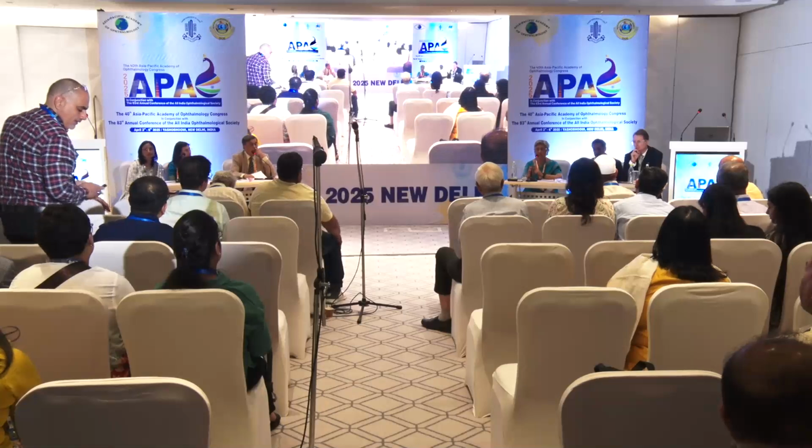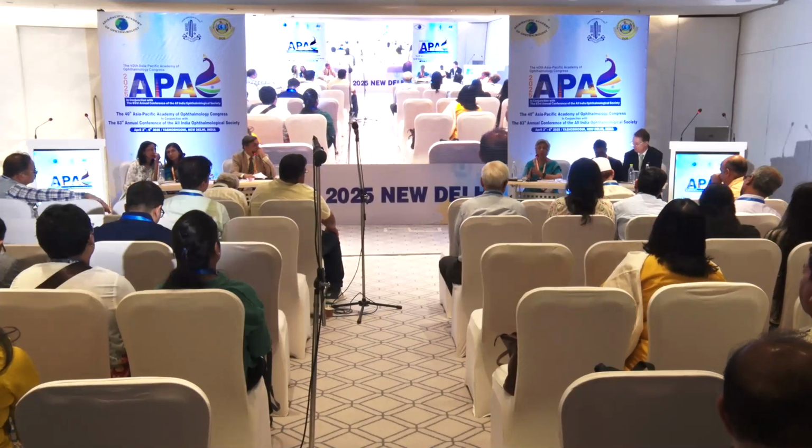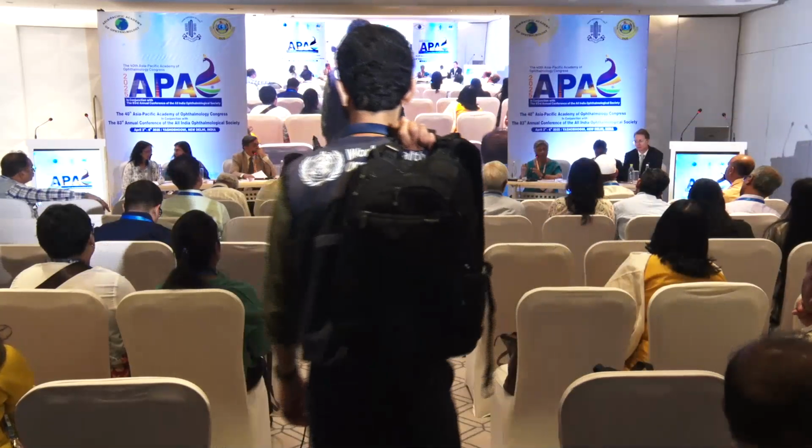No, there is no great difference; the profile should fall within the normative data as per that particular OCT machine. But as of now, there is no normative data for myopes, no normative data for hypermetropes as such. What is very nice is that NIDEC has got a very robust information regarding the RNFL profile.